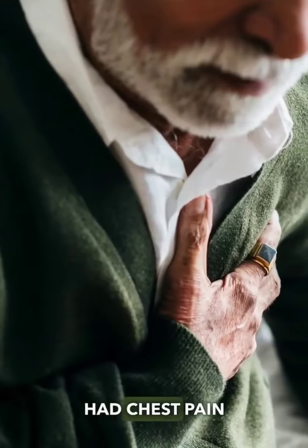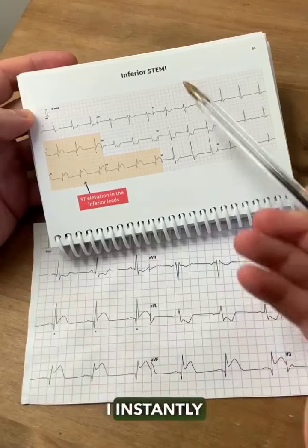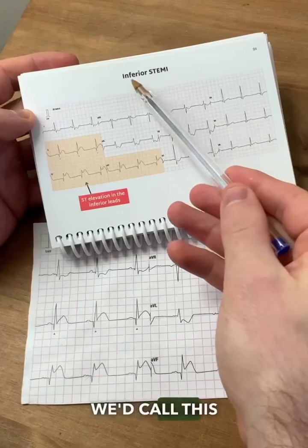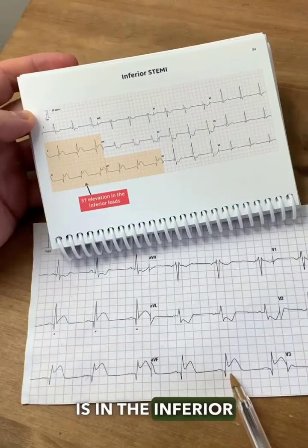This patient had chest pain that sounded cardiac, so once I'd seen this ST elevation, I instantly thought I'm looking at a STEMI, which is a fancy word for a heart attack. We'd call this an inferior STEMI because the ST elevation is in the inferior leads.